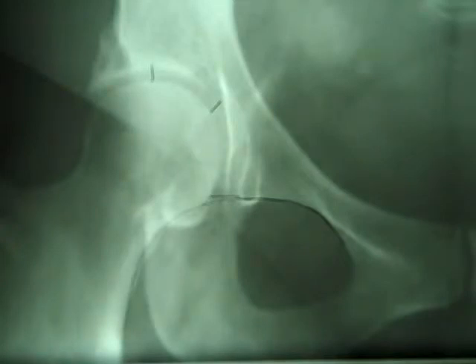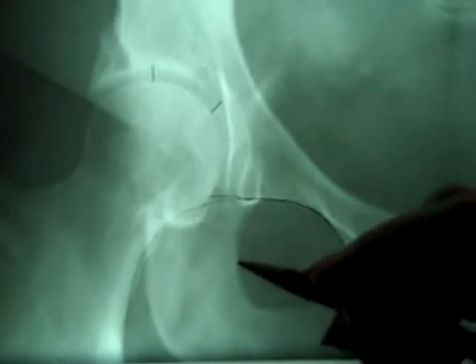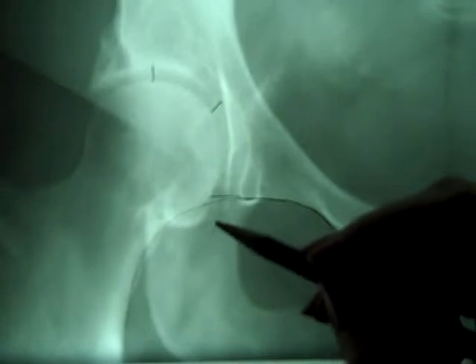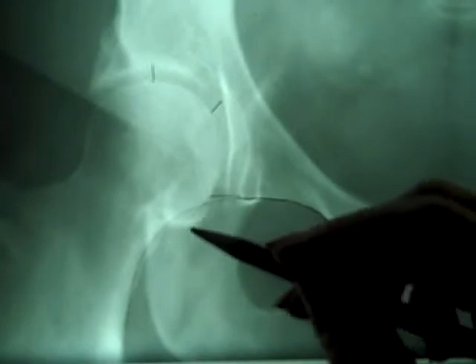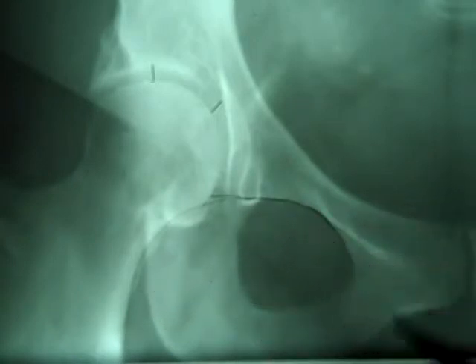So again, that's called Shenton's line. Now, I happen to remember a question one time that asked, is it appropriate to see some of the femoral head extending below Shenton's line? I'm not sure where I read that question, but it sort of haunted me because I didn't know the answer. But if you look in the book, it is understandable and acceptable for a small portion of the femur head to extend below the line, and that's okay. So again, we're using the femoral neck to the top of the obturator foramen, and we're looking for a smooth arc.